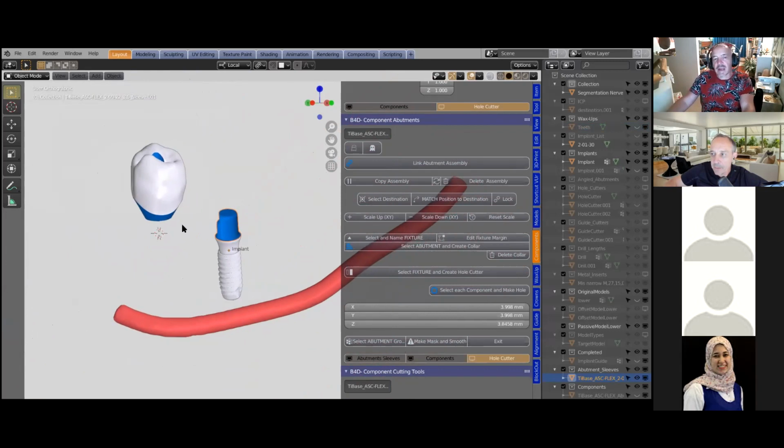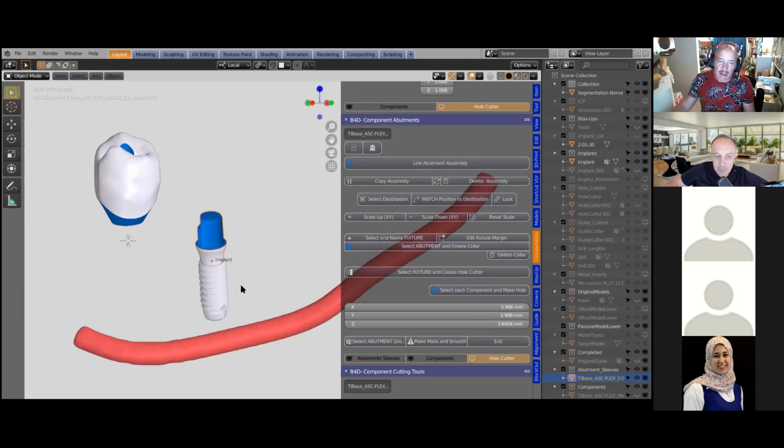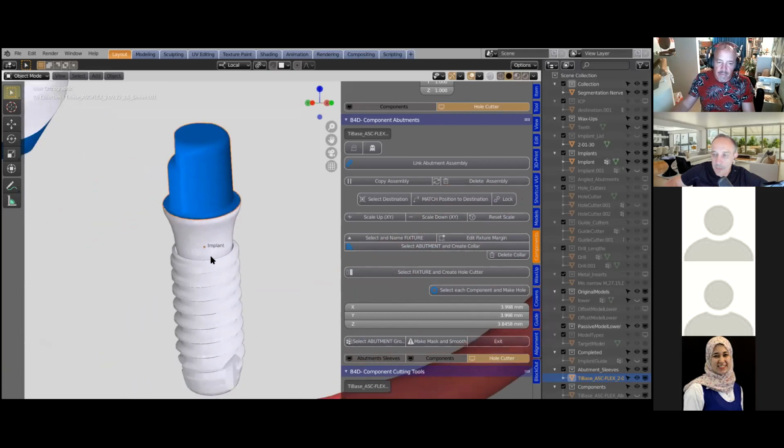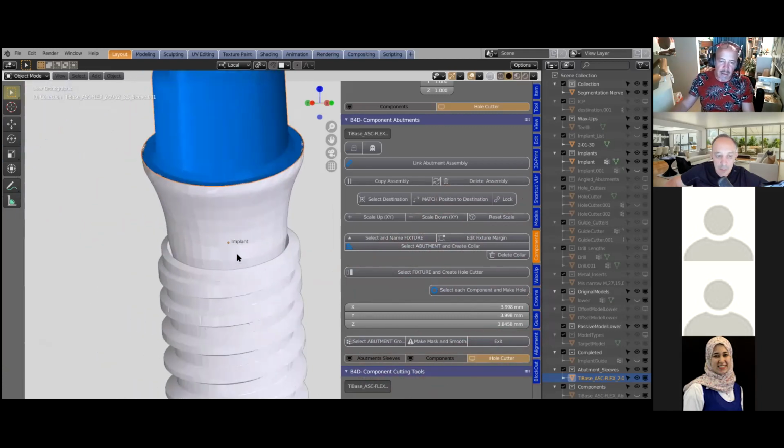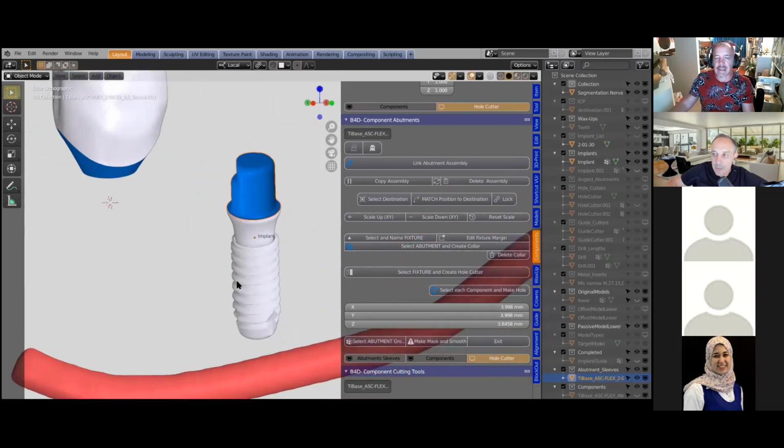In fact, you can take any object and it'll do the same. You can take a cube or whatever, and it'll snap it exactly into that location, because it looks at the point of origin, which is that little orange dot. That's the point of origin, and in Blender space, that point has certain coordinates. So whatever you snap to it will assume those coordinates. Yeah, I hope that answers the question.